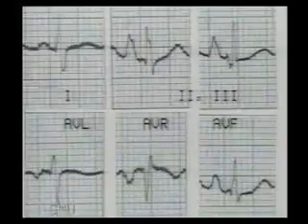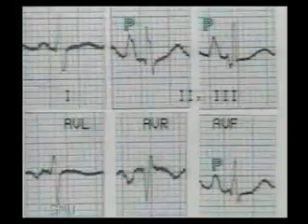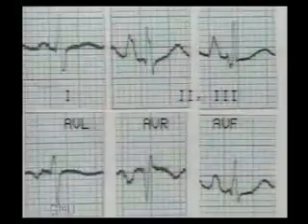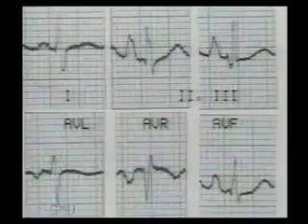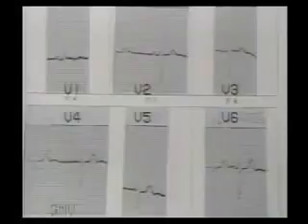Now note the P wave in lead 2. A very typical tall and peaked P pulmonale is seen in leads 2, 3 and AVF, diagnostic of right atrial hypertrophy. So this ECG shows right ventricular hypertrophy with right atrial hypertrophy and right axis deviation. The next ECG shows a prominent R wave in V1 and a deep S wave in V6. So right ventricular hypertrophy is suspected.